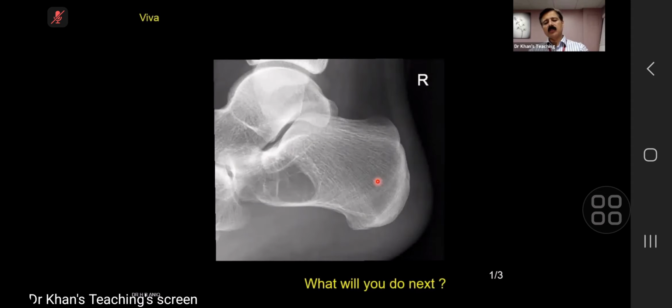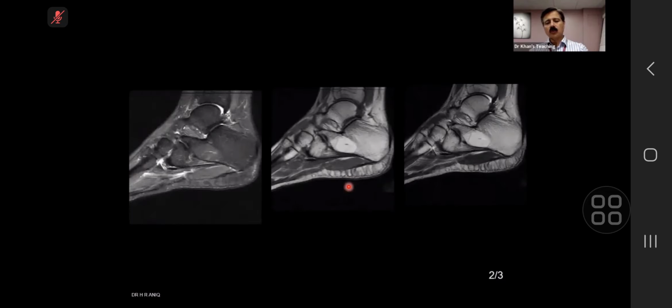Now, please remember that calcaneal lesions per se have a differential diagnosis that changes according to the age. So we have already covered lipoma, simple bone cyst, giant cell tumor, and then hemophilic pseudotumor, brown tumor. All of these can come in the differential diagnosis. Hemophilic pseudotumor in the calcaneum has come in the exam. It's quite a favorite site. I'll show you next time.